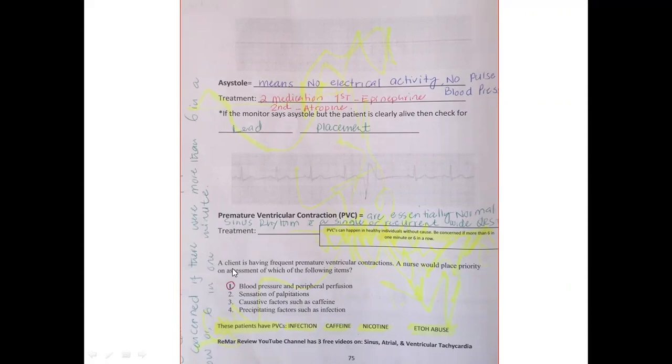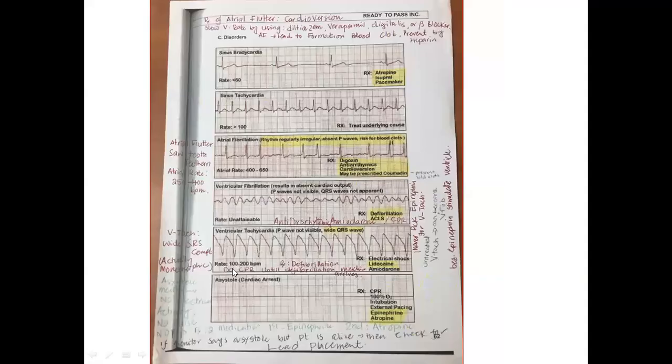So here I said next. In this picture, everything is a short review. Let me show you, and you can see a few pictures as well, the same as what we discussed before. And here I can just review them in short. Okay, so there are some strips we can see.